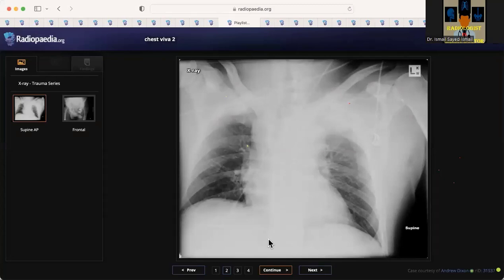Okay, yes. Yeah, do you want? I'm provided with a frontal chest X-ray, which I can see there is opacity in the left lung upper zone, and the right diaphragm is slightly elevated compared to the left, and I can see there is a mediastinal widening on both sides, and the heart is also slightly enlarged.